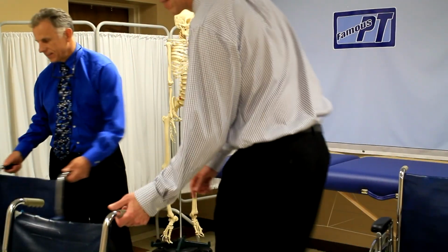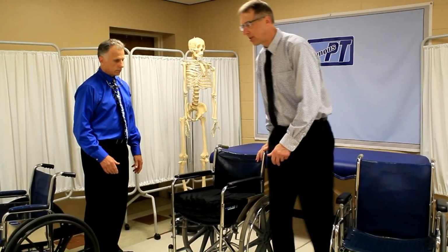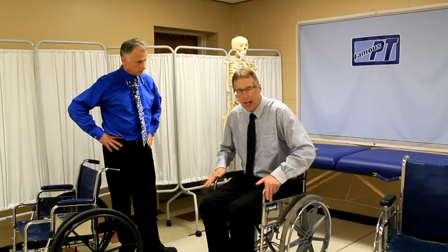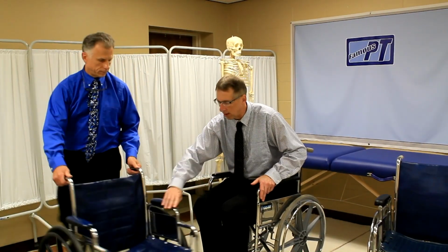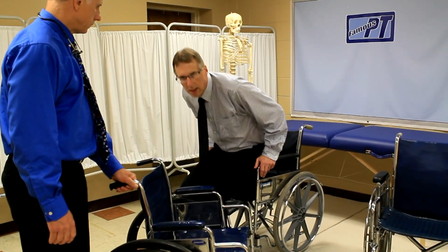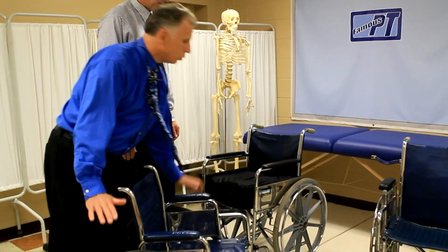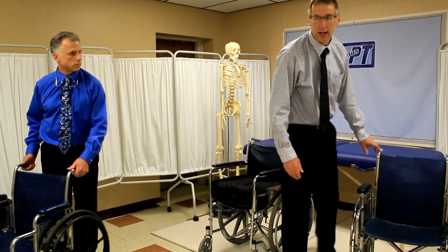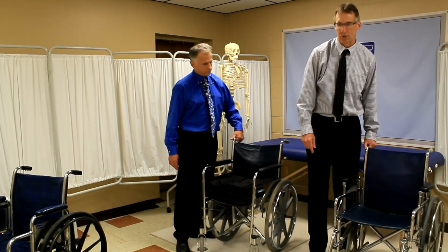All right, the positive thing about a full length though, is that if you are a person that has trouble getting out of your chair, a lot of times you're going to want to be able to get your hands way at the end of the support, as opposed to here where you can't. So when you get out, you go all the way to the end, and now I can really get some good leverage to get up out of the chair. And on the desk chair, it's too low. You don't have the leverage. And I've had patients that could get up with this and could not get up with that. So it's not an unusual thing.